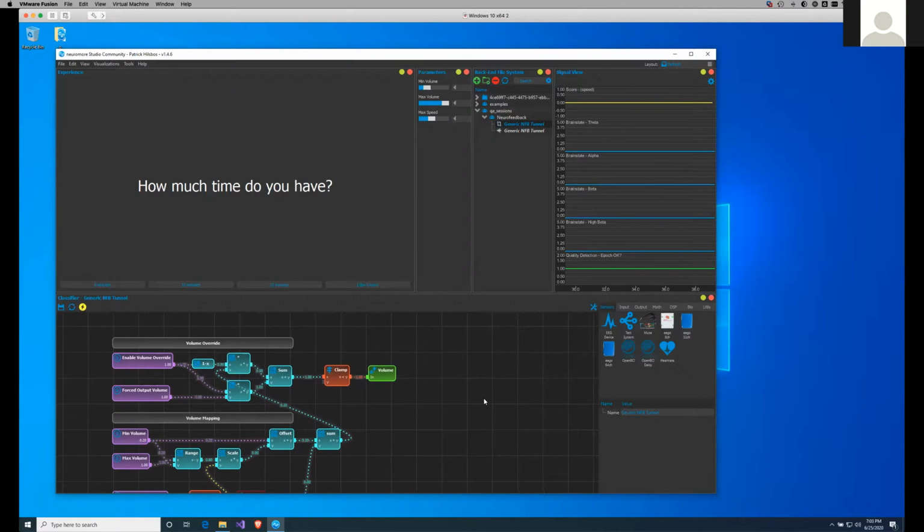And for video, we also have 2 feedback nodes, I believe, but I don't know it by heart. We'll add it later on. I believe they're called video alpha and video grayscale. You can use those 2 feedback nodes to control the video that's being played in that particular experience window. That being said, it's also important to mention that you do not need those visualizations that we just showed you to have a full-blown neurofeedback experience. Of course, you can also just use audio, and you can play videos within that experience window, and then control currently the alpha channel and the color saturation that we offer.